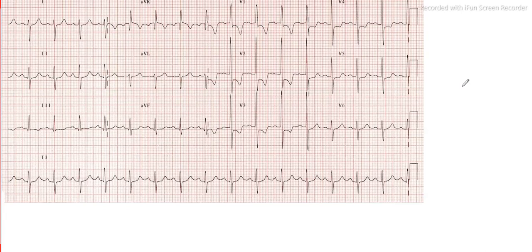In the theoretical portion, we have already discussed that if you want to find any abnormalities due to ventricular enlargement, then the basic leads that you need to focus on are lead V1 and lead V6. So these are the two basic leads that you need to focus on. Why do you need to focus on these two leads? Let me explain it quickly.